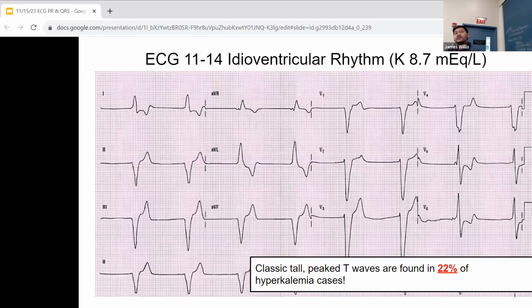All right, hopefully if the attending saw this EKG, they would send this patient to CCT and they would get calcium, whether in the hallway or on a monitor or not. But the triage. Yeah. Fast track, yeah.